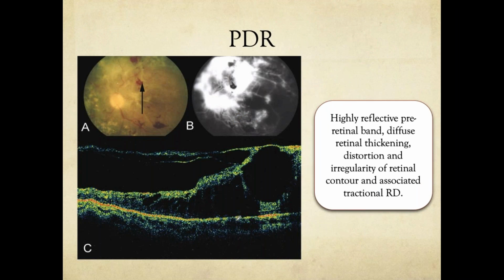So for PDR, OCT usually does not have any advantage, especially it's to figure out if there is a macular edema or tractions. For PDR, you can do an angiography. This is an FFA, or you can also do an OCT angiography. And for this, if the PDR has a lot of traction membranes, go inside, do a vitrectomy, do a PRP, then put an anti-VEGF. No traction, just a PRP.